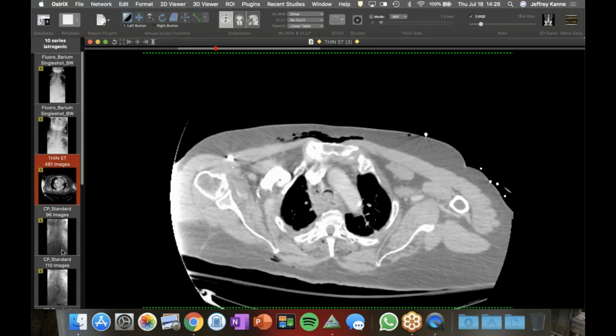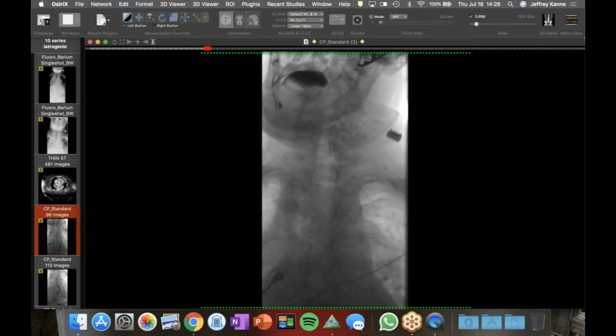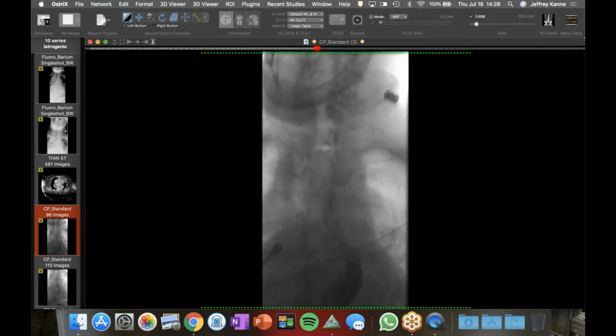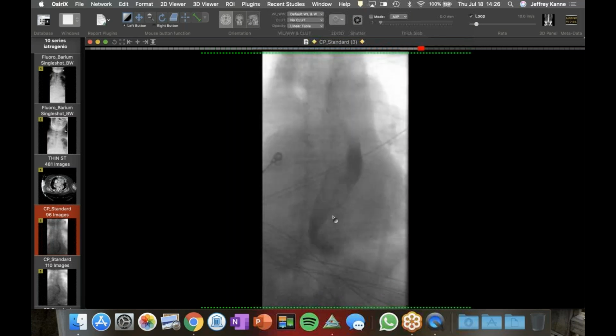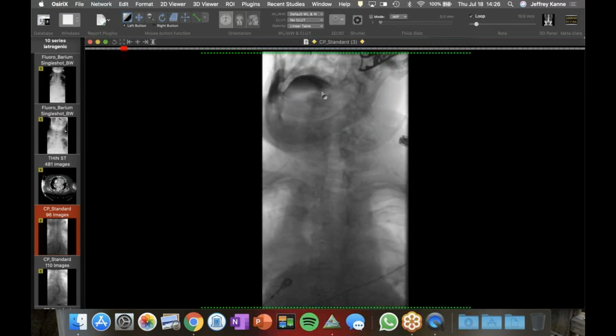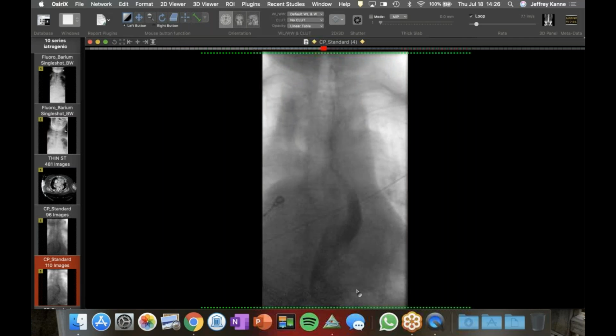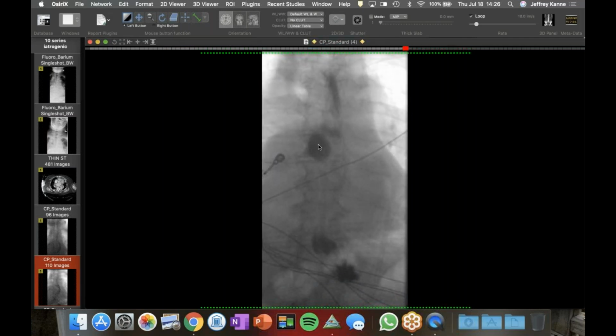And so I'm going to show you some images from an esophagram. And so here we go. So this was done after the surgery, and you can see some motility issues, but then right there you see it spill out, and I'll show you another sequence. So then here's another swallow, and you can see there's some motility, but as they scroll down, you see right there it spills out. So it looks like there's a little neck there, sort of right at the subcarinal space.